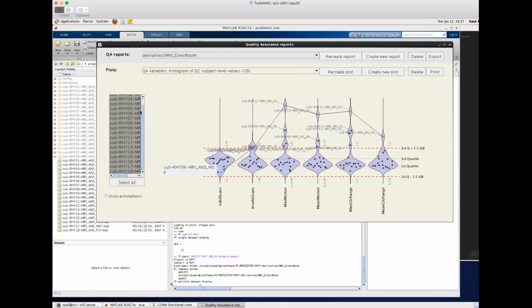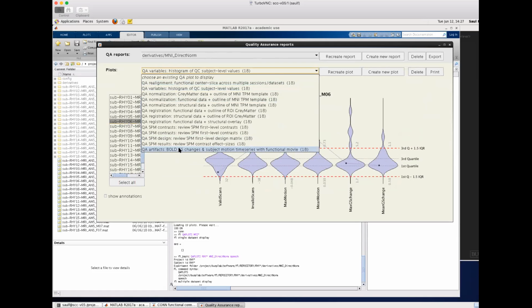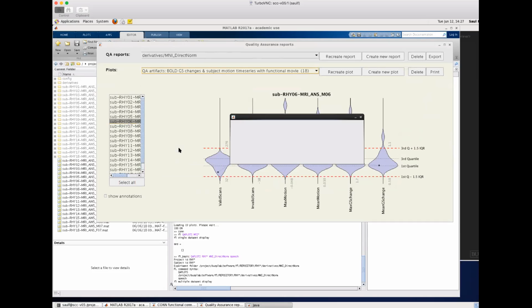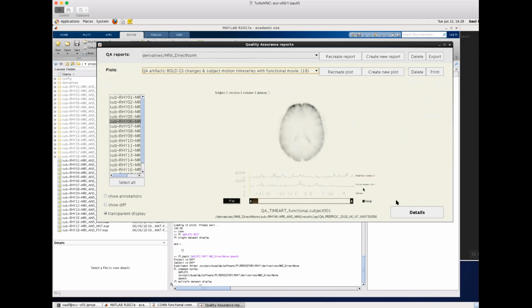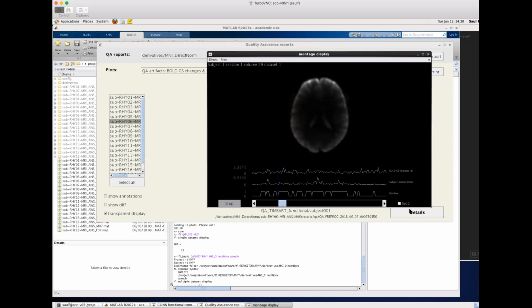So can we do the same thing for subject 6? Can we look at the time series just to see the location of those scans, motion, and whether there is anything else that might be worrisome in there? Yeah, that plot exactly. Right. So yes, there's still motion in the corrected. It seems like the first two sessions were very noisy, and perhaps the third session was much better.